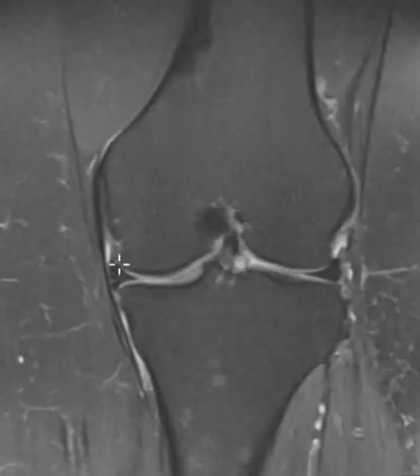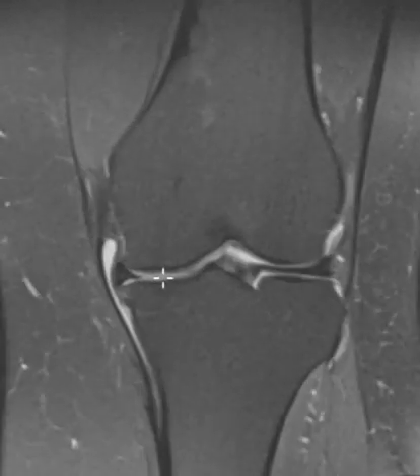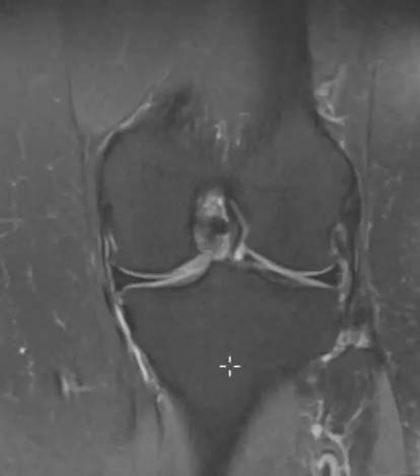Here's the back of the meniscus, medial meniscus. This is called the meniscus body here. Here's the front, which we call the anterior horn, so that looks good. And the medial collateral ligament, the MCL, comes off the femur here. This is the big thigh bone, the femur. The medial collateral ligament comes down here and attaches to the tibia down below.